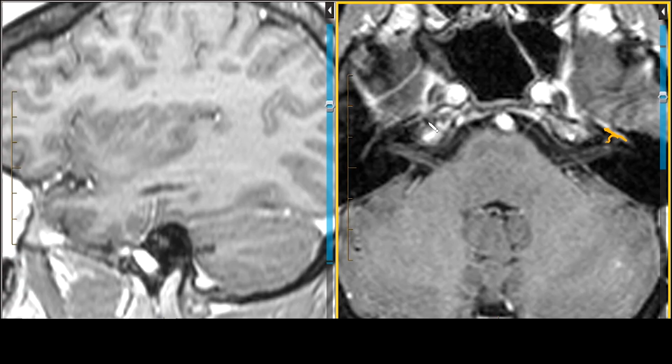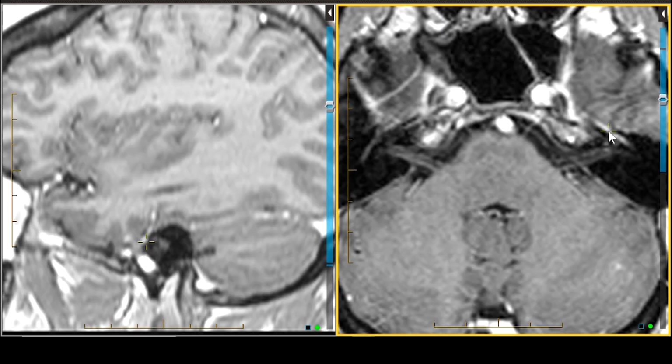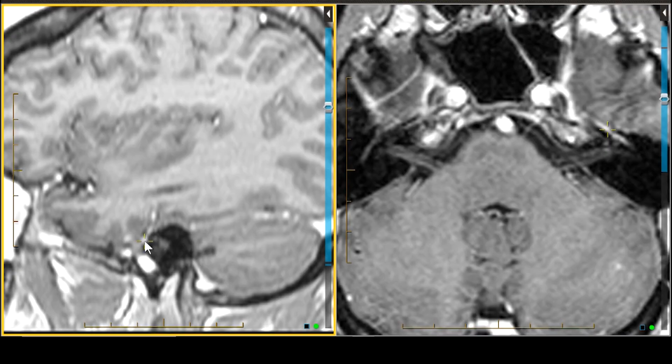It also has taste fibers for the lesser palatine nerve and the palate, and also the greater palatine nerve. It contributes to the otic ganglion, and it arises again at the level of the geniculate ganglion where it joins the lesser petrosal nerve to reach the otic ganglion. In the sagittal projection, if you want to find that nerve, you can just cross-reference. Let's take our little cross-reference marker right here. There is our geniculate area right there, and just in front of it, you're going to find the greater petrosal nerve. So right there is going to be the greater petrosal nerve, which again is slightly hyperintense for reasons we already mentioned. Dr. P out.